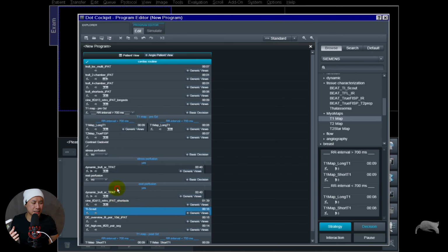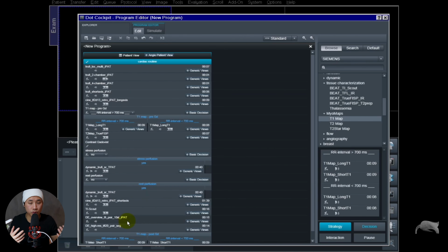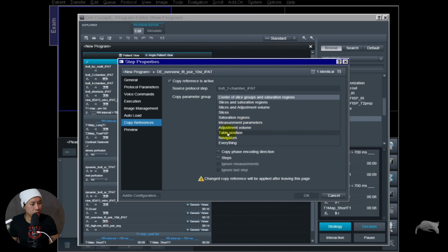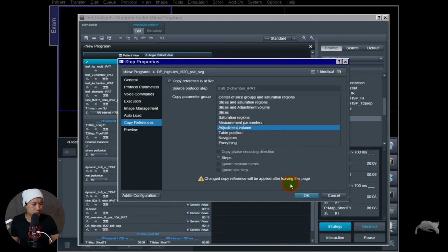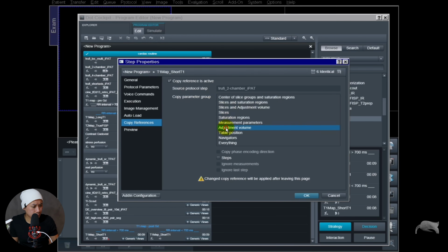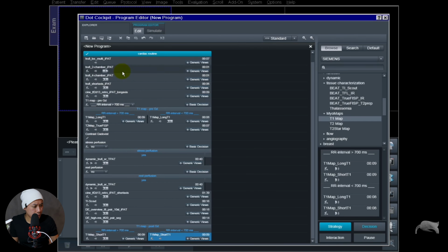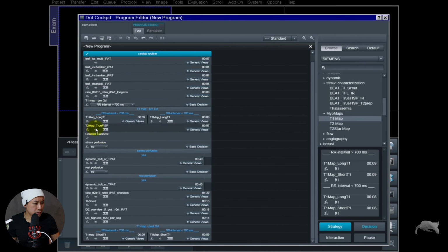However, this is something more like set and go, when you just do it and forget it. It's nothing you should do or have to do every day, right? It's just that building a protocol takes time, so keep your mind clear, and yeah, you know it takes time. Perfect. Adjustment bullet. Okay, now we are finished.